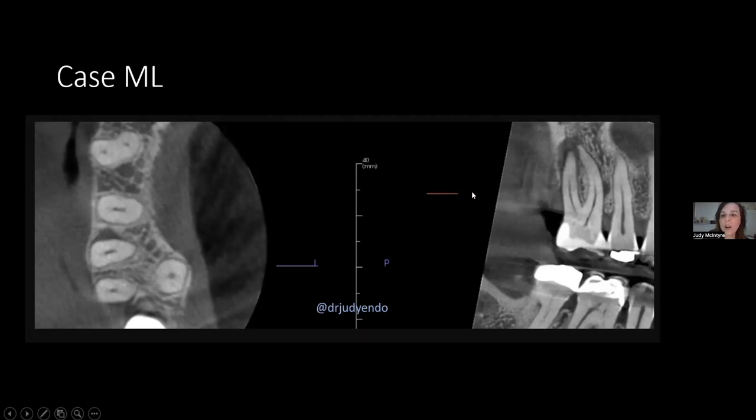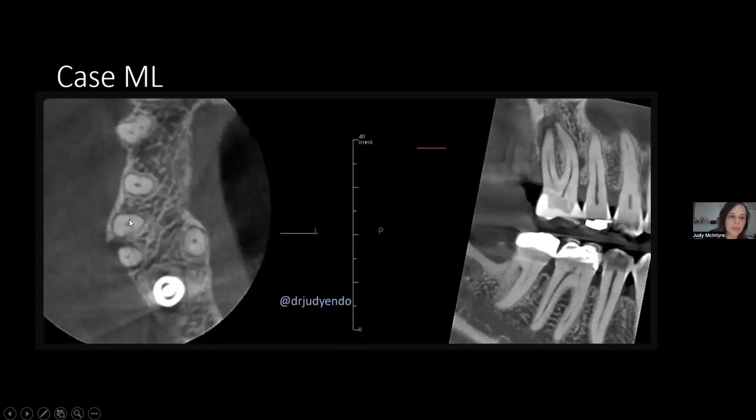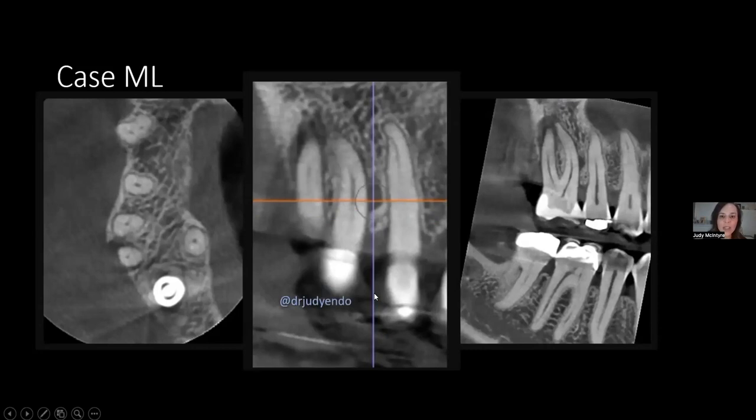So we are at this level. We are at, with this orange orientation, this level of the lateral lucency, and here we can see the lateral lucency. Sometimes, not in this case, but sometimes we will see the canal with a little faint branch. If we go up to this section right here, we actually can pick it up. See this little branch right here? Little faint line, and it corresponds, see, right here to that lateral lucency. Right there, we're back, and then again, you can see this one that I picked up on right here.